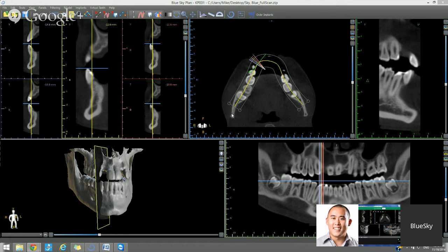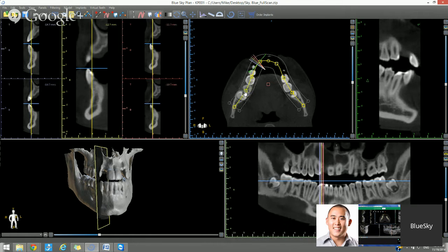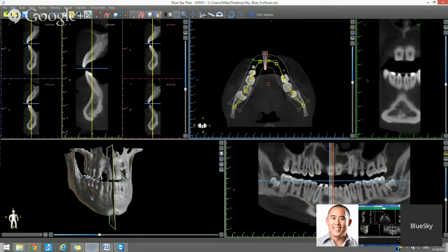So we just discussed the panoramic. The purpose of the panoramic is that it affects our other views. The bottom panoramic view is affected by the placement of the curve. You could watch, if I throw off the curve, you could watch how it affects the panoramic view. Okay? It also affects our cross-sections view, that as you're going around to look at those vertical slices, it's running along the curve. So you could think of the curve as kind of like a track that dictates the positioning of the other views.